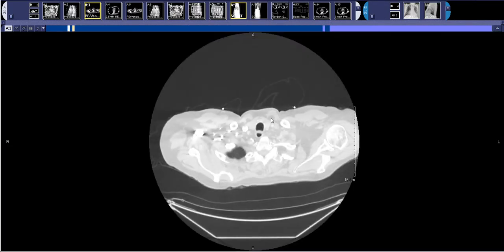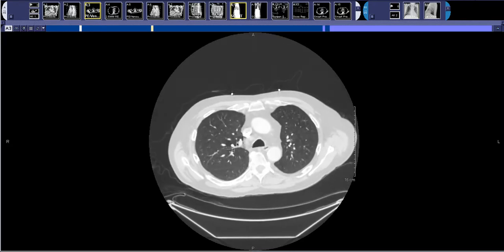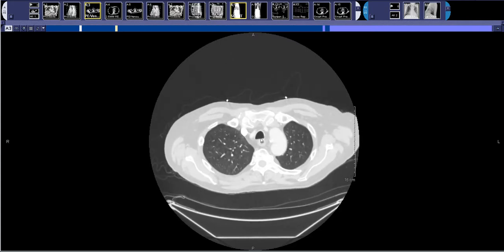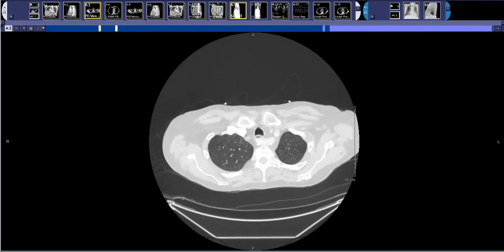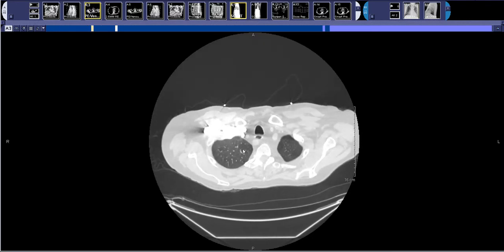Once I'm in my lung windows, I scroll down real quick. I look at the trachea. I look for anything inside the trachea. I try to make a decision about how well aerated the lungs are based on how flattened or bowed the posterior wall of the trachea is. And then I start looking in the lungs. I go up and down on each side, so I go through the lungs 4 times.